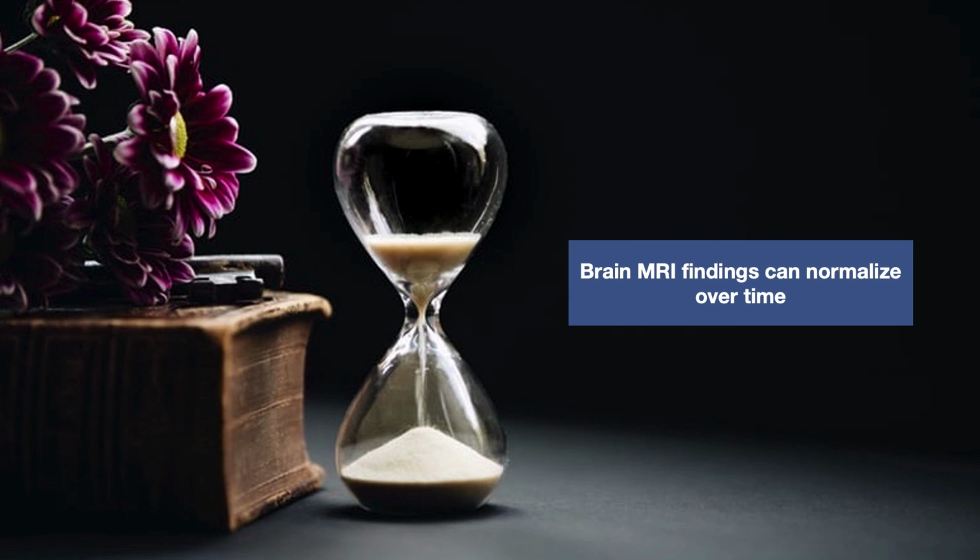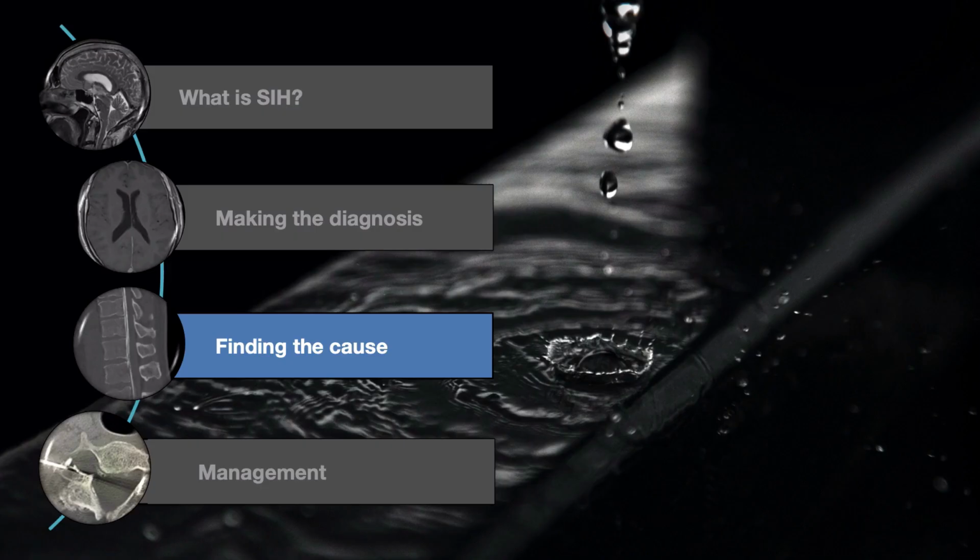Now, we've talked about how brain MRI may show all or only some of the typical findings to varying degrees. But it's actually reported to be normal in up to 20% of patients later proven to have a leak, but with a good clinical history. And it's more often normal in patients with a longer duration of symptoms, which leads to further delay in diagnosis. So if the history is good, go back and look for those imaging clues again, particularly on the initial imaging.